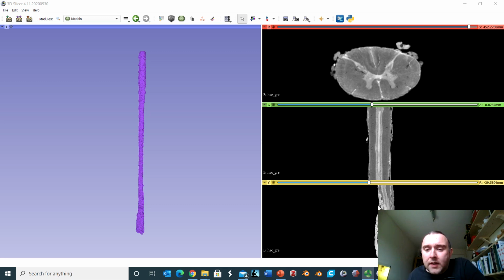At the bottom, in the sagittal plane, we can see the termination of the spinal cord at around this point here at the conus medullaris. We can see the white matter of the cord and the grey, and furthermore we can see how this more distal end of the cord is surrounded by the cauda equina, all of these dorsal and ventral roots forming this horse's tail shaped structure down at the bottom.